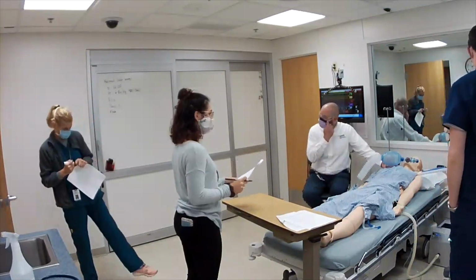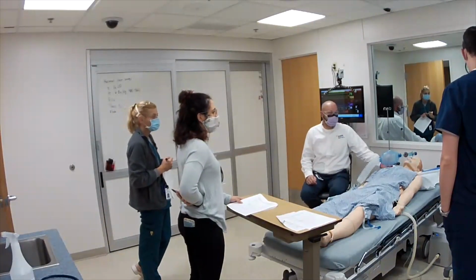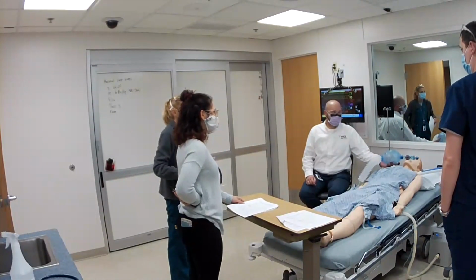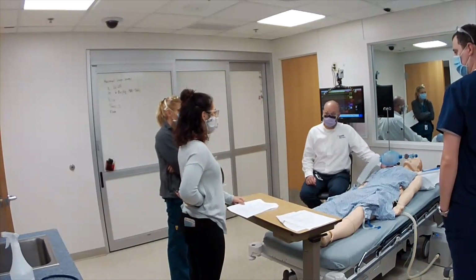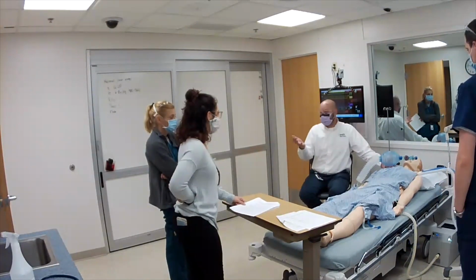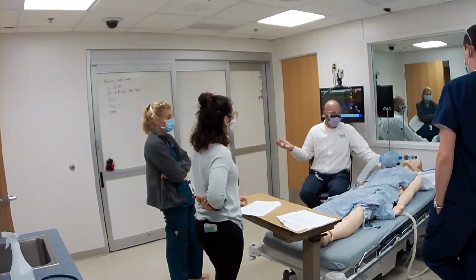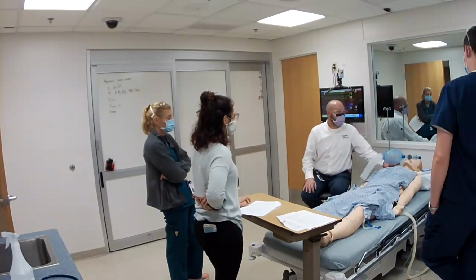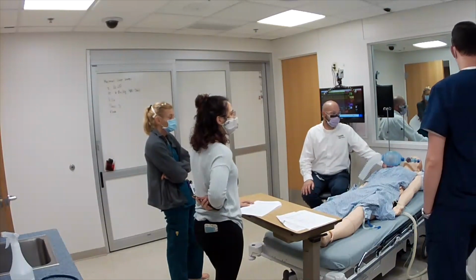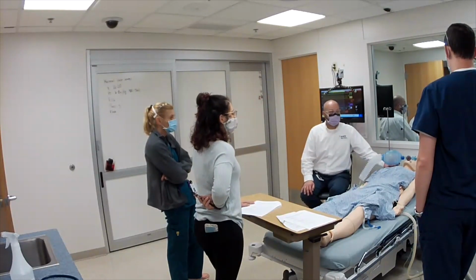What is volume control? It is a set volume, set rate, set PEEP, set FiO2. Pressure just varies. Right, this is just physics. You have volume and pressure, and you can choose to control one. The other one has to be a variable. So in that case, we're choosing to control the volume, which means the pressure has to be variable. What are the advantages to putting a patient on volume control? Knowing exactly how much volume you're giving at any given point.